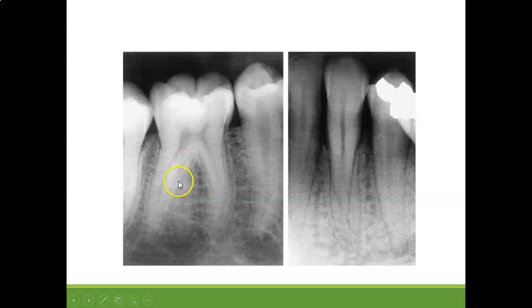Here we have a supernumerary root. You can see this is a mandibular root with the 2 mesial and distal roots, and then down in between we have a third root that you would see on the maxilla, but this is on the mandible. So there's a supernumerary root on this mandibular molar, and then here they're superimposed over each other, but you can see there's two roots on this, I think this is a canine. So on this canine there's two roots there. You can see here and here and here.